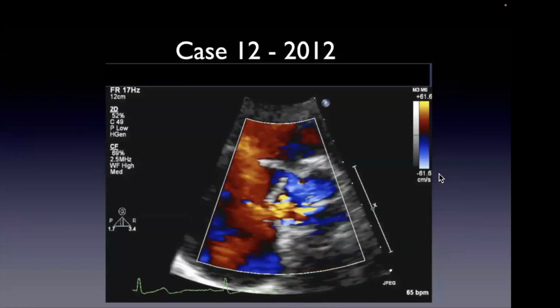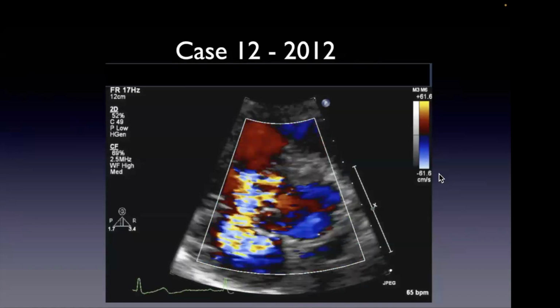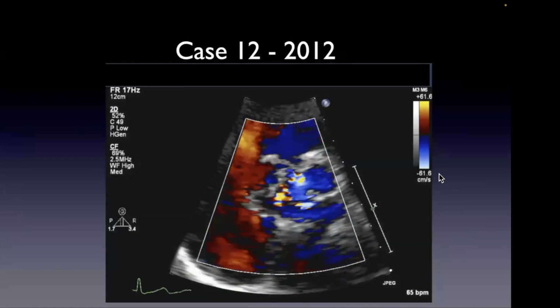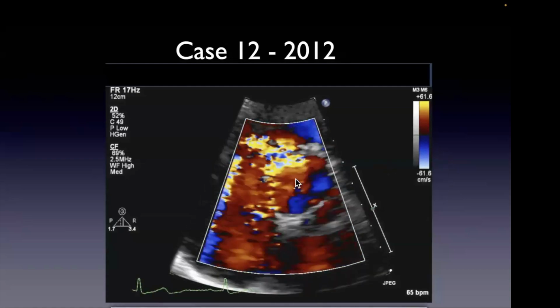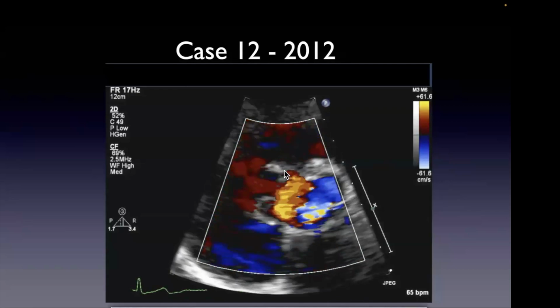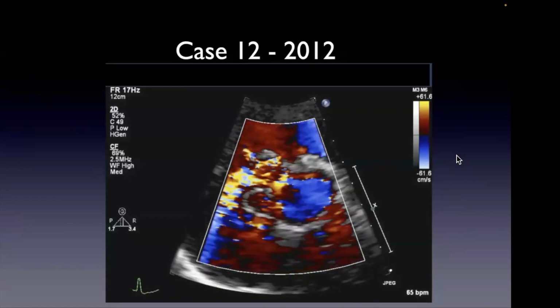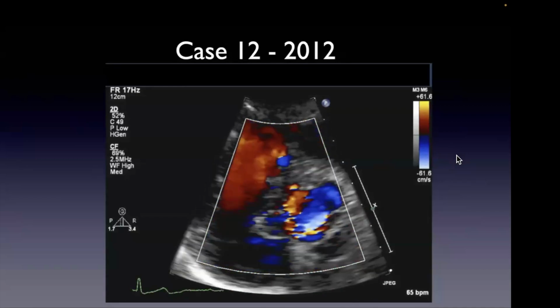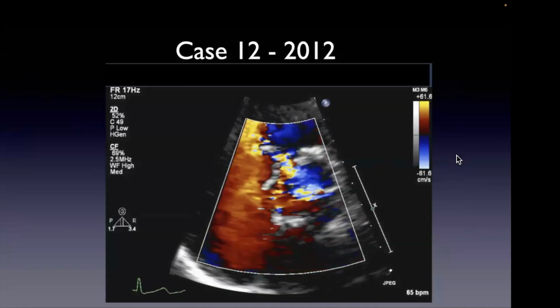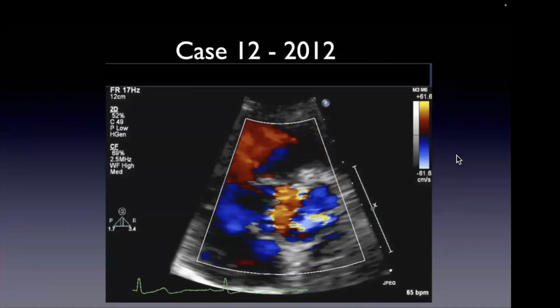What about this? Does that change your mind about VSD? It's kind of competing with concomitant tricuspid regurgitation. You can see the flow convergence, as to Mike's point, is kind of up here, although it's right where the septal leaflet attaches, right? Yeah. So the differential, at least on this view, without getting other ancillary imaging, is a Gerbode defect, which is an LVOT into RA, or LV into RA. But the timing for that is usually more continuous because of the pressure differences.